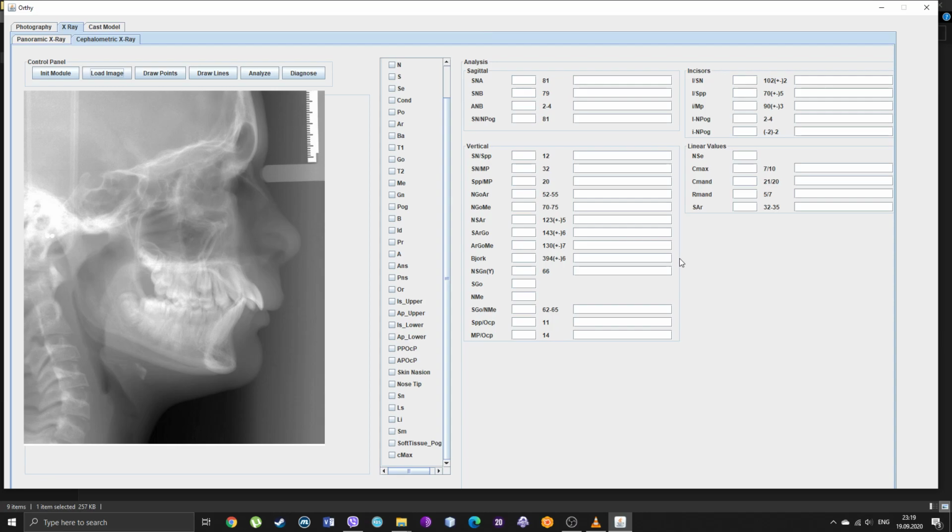They are here because I will upgrade this program someday when I have more time. Currently I'm out of time. Time is the enemy. Let's repeat: you have to select each and every one of these points.